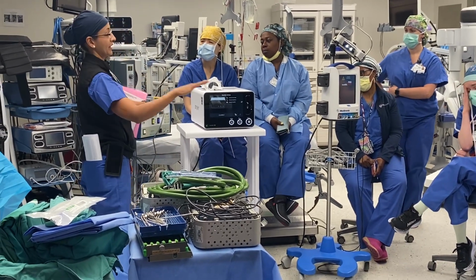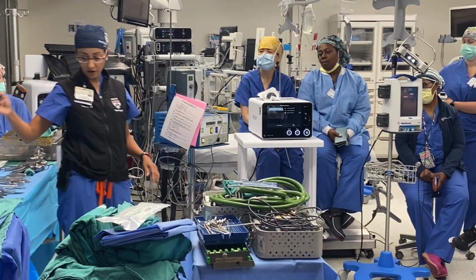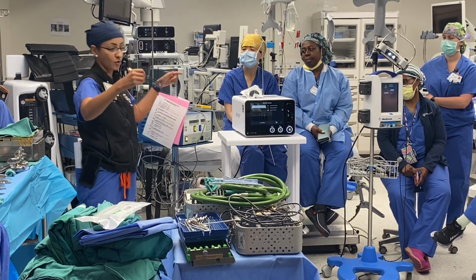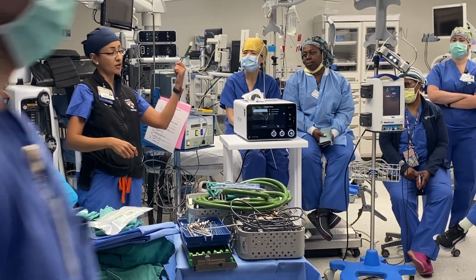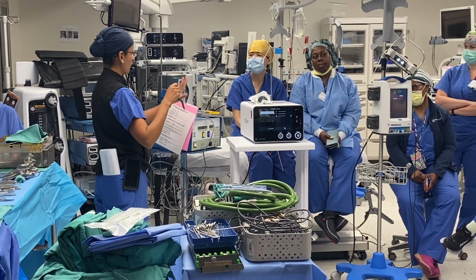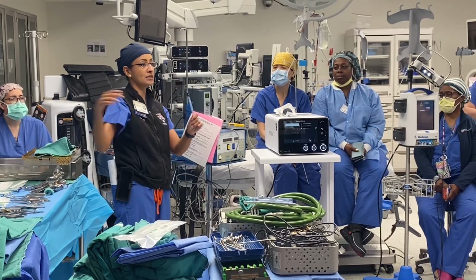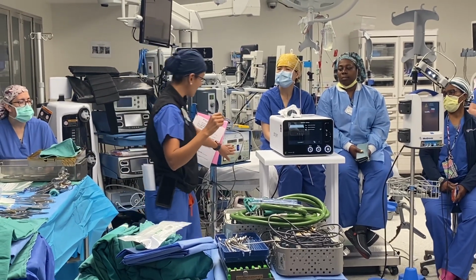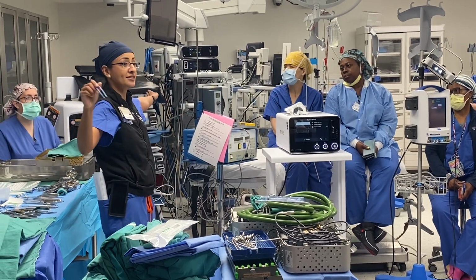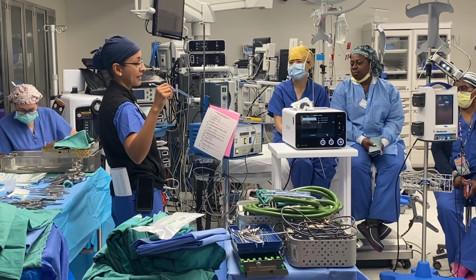Bipolar, again, every case pretty much is set up with a bipolar. That's the workhorse for us in all of our cases. The Malis is the one with the irrigator. The greens are called Kerwins. This is the one that has to work with this. If we're doing a regular bipolar, these are always part of any tray. So that gets connected to your regular, right? And tell me if I'm wrong, guys, because I don't know. The regular goes to the regular Bovie setup and all that.